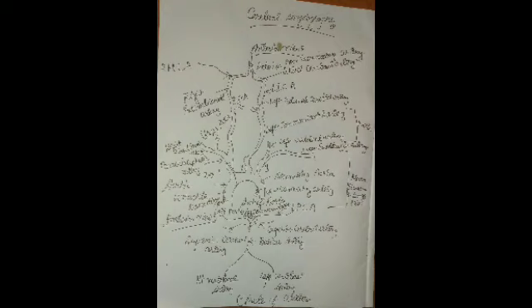Similarly, the second branch goes upward anteriorly, that is the left common carotid. It will be mentioned as LCCA. You have to know the short forms, so it will be easy for you when you are doing the post processing, because it is not possible for us to write out all these things. Next, the third branch on the left side immediately rises up and gives two branches. One moves to the lateral side, giving the left subclavian artery, and posteriorly it gives the LVA. I hope it is clear now. LVA means left vertebral artery.